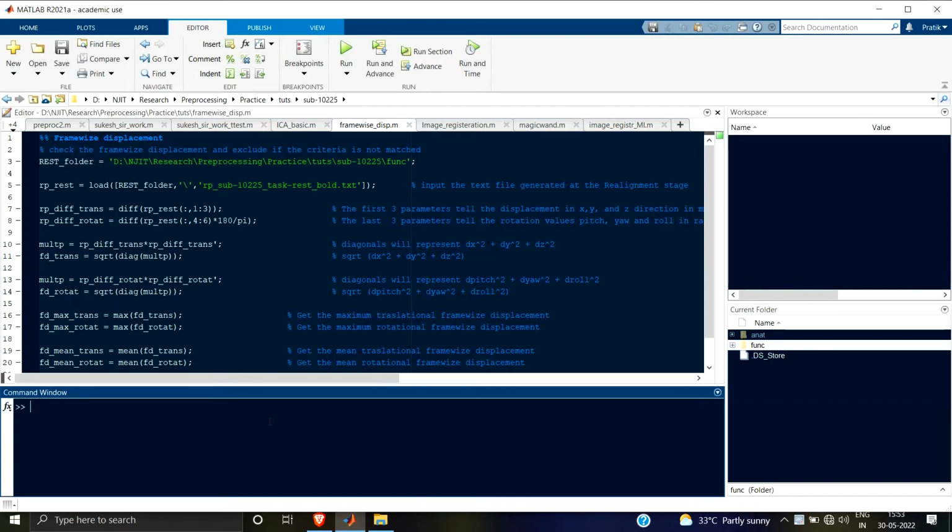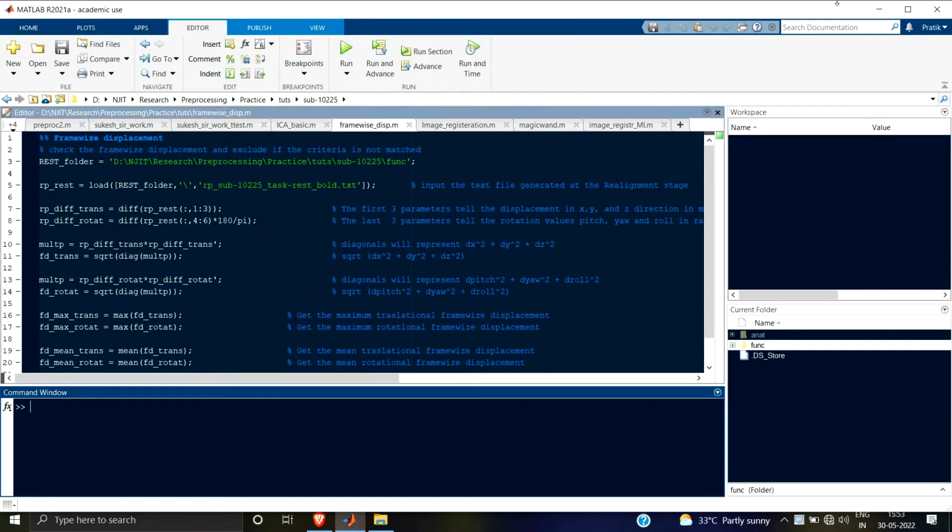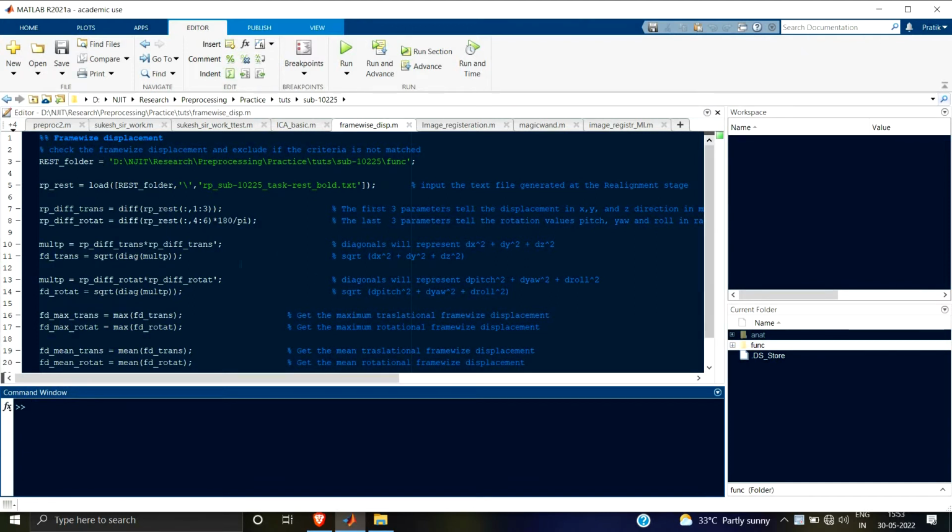Hello guys. So in the previous video we saw why co-registration, segmentation and regression are important. That was a theory video. So if in case you have not seen that video and if you don't know why we use co-registration, then you can click on the I button over here to go to that video.